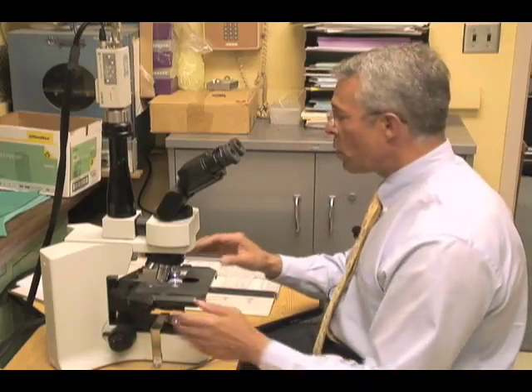The learning curve is quite steep, and one gets used to these samples quite readily, and the diagnosis on these SpiraBrush samples can reach identical levels to diagnoses in biopsy specimens, so that in a laboratory, most of the SpiraBrush samples should be diagnostic and not equivocal in any nature.